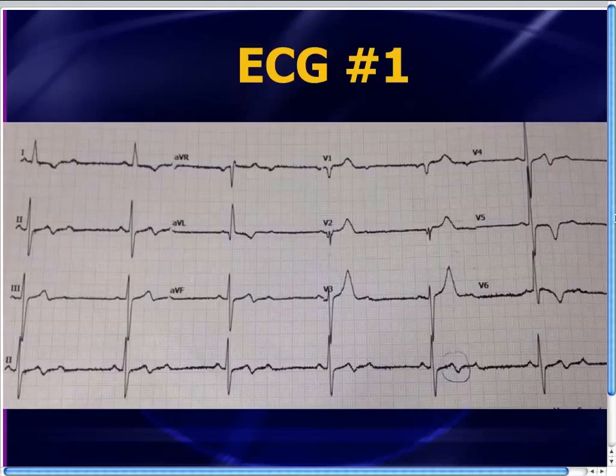So I think right off the bat, we can get rid of third degree heart block because the PR intervals, wherever they are conducted, are all staying the same. There's no random changing. So this is not third degree. That means this is a second degree AV block, and there are 2 P waves for every 1 QRS complex. And when there are only 2 P waves for every 1 QRS complex, you actually can't really tell if it's Mobitz 1 or Mobitz 2, because you need to have enough PQRS complexes to see whether the PR is increasing or staying constant. And if it's 2-to-1 AV block, you can't really tell whether it's increasing or staying constant.